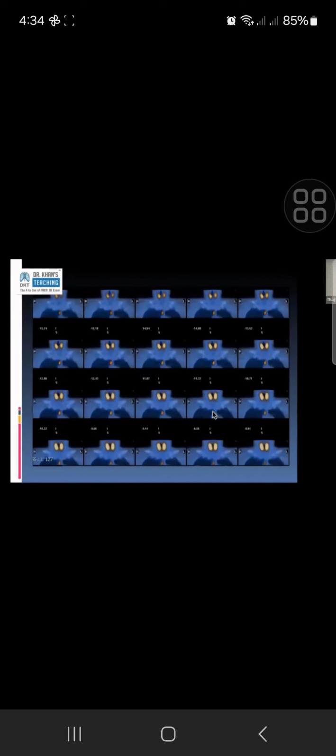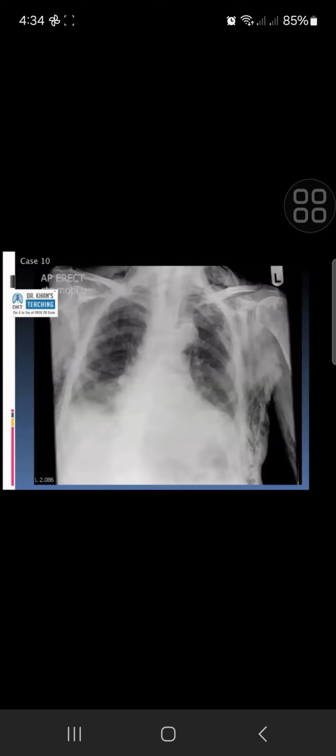That's a parathyroid adenoma, and that's a thyroid gland. But technetium is taken up only by the thyroid gland. So when you subtract the technetium image from the sestamibi image, you will see only the parathyroid adenoma. And now that's not in the neck; it's in the superior upper mediastinum. So that's an ectopic parathyroid adenoma in the chest. Wow. That's the SPECT CT image showing the ectopic parathyroid adenoma.